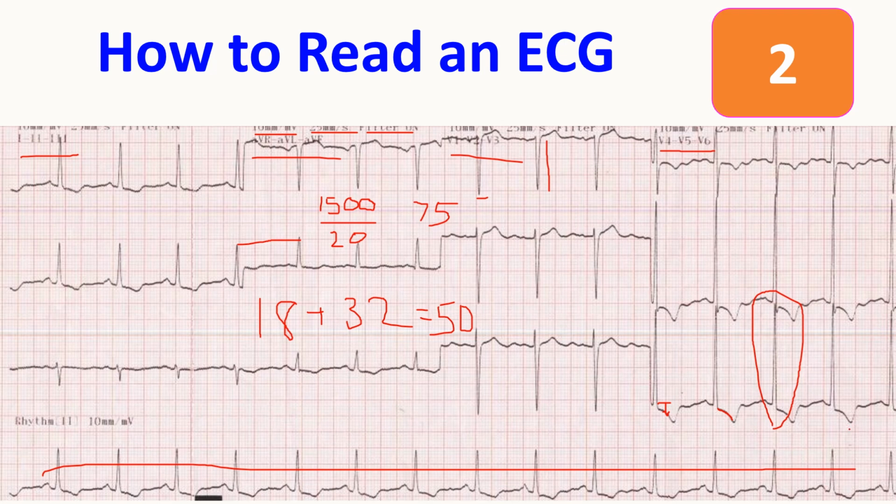And the T wave is inverted. The T inversion is asymmetric. This is a more sharper rise, while this is a slightly curved descent. This asymmetric T inversion, ST depression, downsloping, is part of the strain pattern.